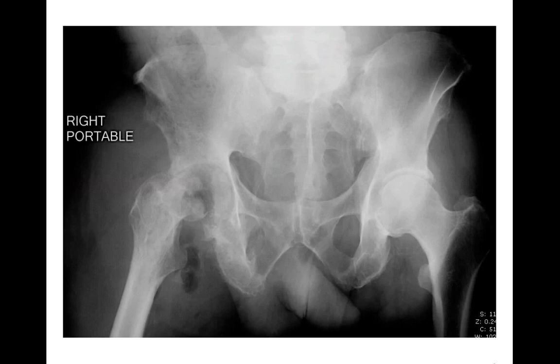All right, next case, a radiograph of the pelvis. In this case, we have a destructive lesion which has destroyed the proximal femoral head. There are these small lytic lucencies through the proximal femur and the iliac wing. So this is a permeative lesion. It's destructive, destroyed part of the proximal femur. So something aggressive here in this case. We're not going to think of any benign things in this case.